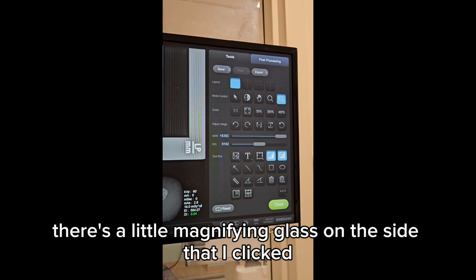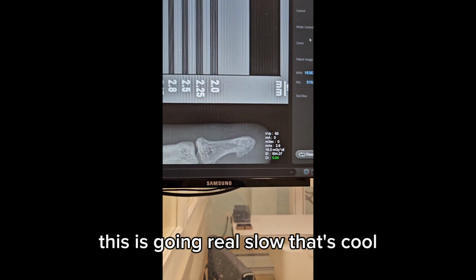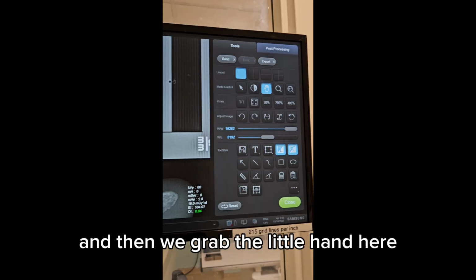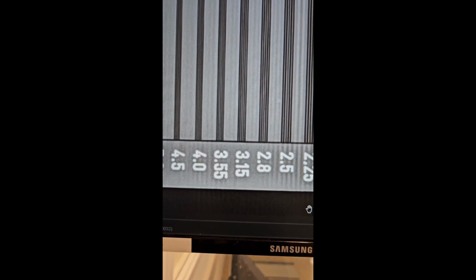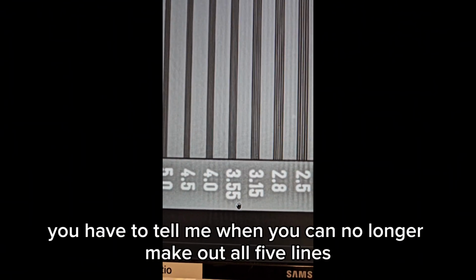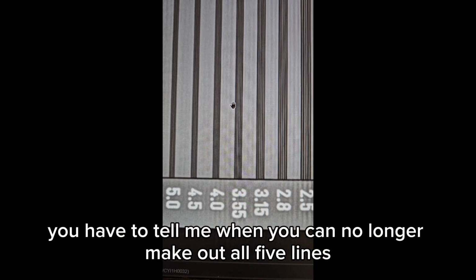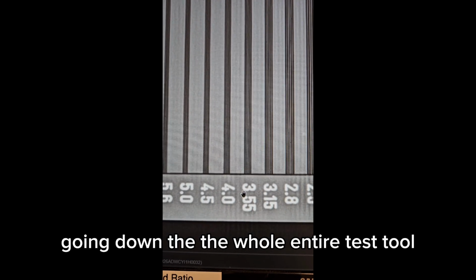There's a little magnifying glass on the side that I clicked. This is going real slow. That's cool. And then we grab the little hand here and I move this around. All right, so again, this is kind of subjective. At a certain point, you have to tell me when you can no longer make out all 5 lines going down the whole entire test tool.